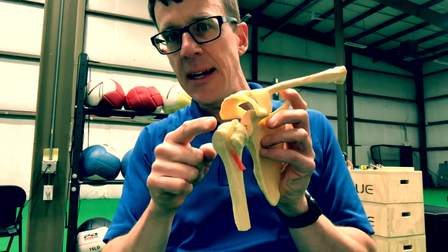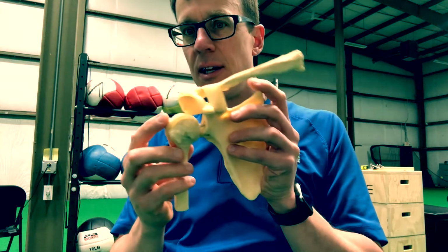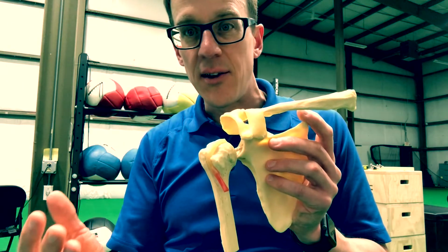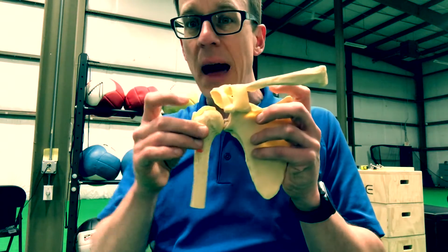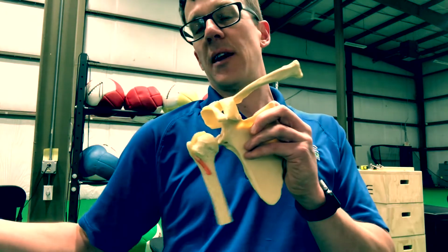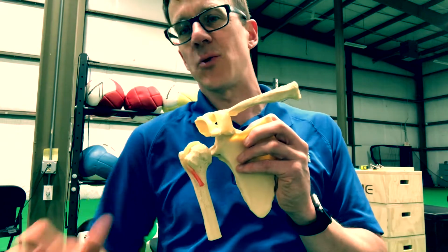So your MRI might say tearing of the infraspinatus or supraspinatus, and they're just referring to out here where the tendon is, where the muscles end in tendons, and where that tendon attaches to this little ridge here on your humerus. There's wear and tear that occurs throughout that area, known as rotator cuff tears. So they'll see degeneration of the tissue, or actually traumatic breaking of the tissue if you fall. And you can imagine getting an arm tugged really hard where it almost gets dislocated or does get dislocated. That tissue, as we get older, tends to fail, and we get rotator cuff tears with trauma.